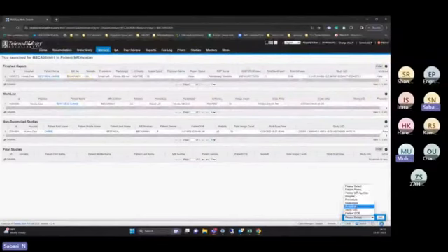But when we are searching from the bottom, this is called a global search feature. We can use multiple options: patient name, patient medical record number, modality, study ID of the patient scan, and patient date of birth and everything.